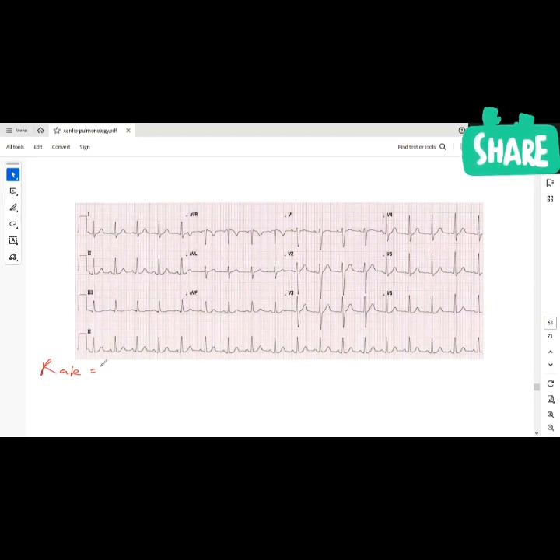We know how to estimate rate, which you already did multiple times: 300 divided by the number of big boxes between two adjacent waves. It could be between two adjacent R waves, two adjacent P waves, two adjacent Q waves, or two adjacent T waves. You can use any of those. In this case, for instance, we have this one R, this one R. How many big boxes do we have? 1, 2, 3. And that corresponds to what? 100 beats per minute, correct?